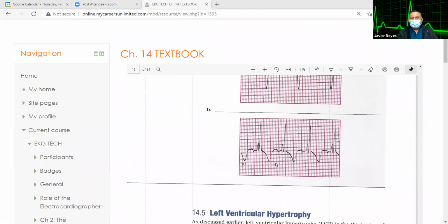Also on B, if you look at it, I know it slides down, but it also looks like two little peaks, right? You have your R and then you have another one. They also refer to that as bunny ears, rabbit ears. Like two little pointy things that look like rabbit ears.